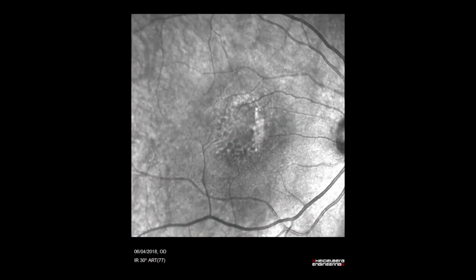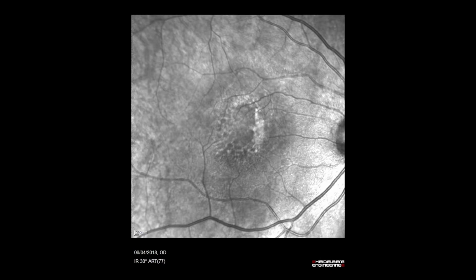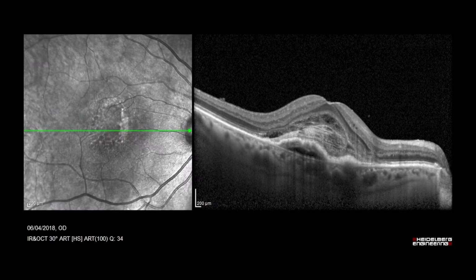In some cases, utilizing the B-scan information with the flow overlay may be more valuable than looking at the transverse section OCTA image. In this particular case, we have an elderly patient who's been undergoing anti-VEGF therapy, who now has an area of retinal pigment epithelial detachment, subretinal fluid, intraretinal fluid, and subretinal fibrosis. The B-scan image confirms this appearance.